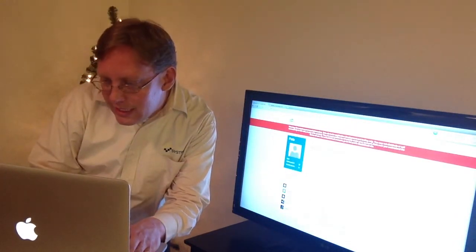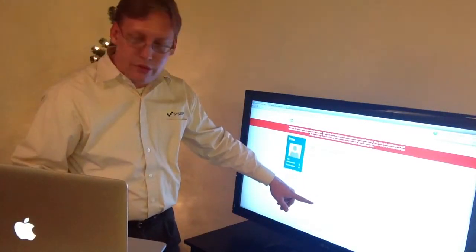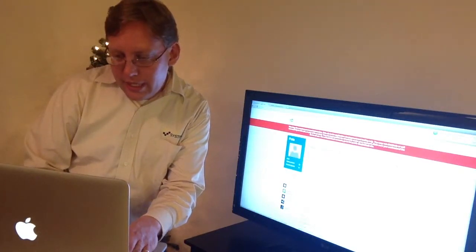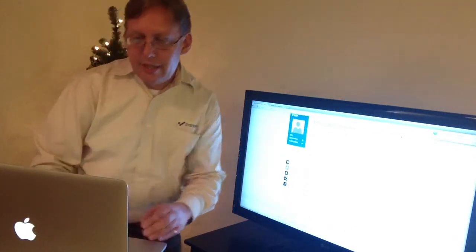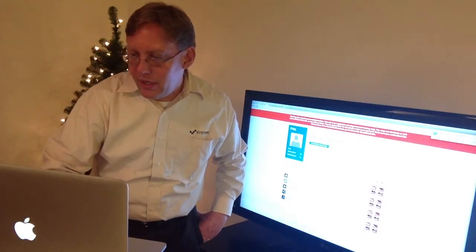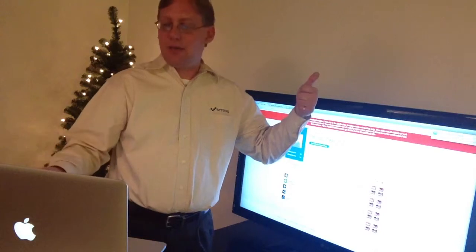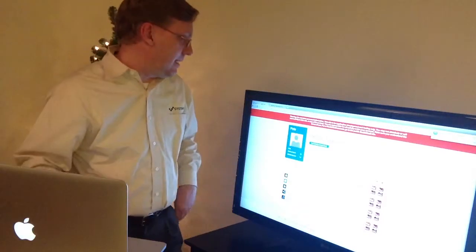So we're going to come in here and take a look at some health assessments and see here the pressure ulcer risk assessment, and we're going to click on the details of that, and then we're going to see down here the Braden scores and the total scores when they were captured and the date and time they were captured. And in addition to that, we're going to go back to the health information, and we're going to take a look at what's called the medical image study, and we're going to see some sample images that had been previously uploaded related to pressure ulcers, and these would come directly from the camera given that the Azure application is pointed to by the mobile app, which is already in place as of this week.